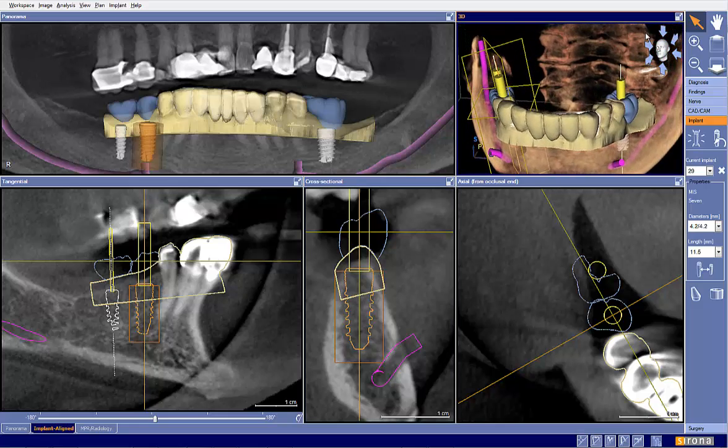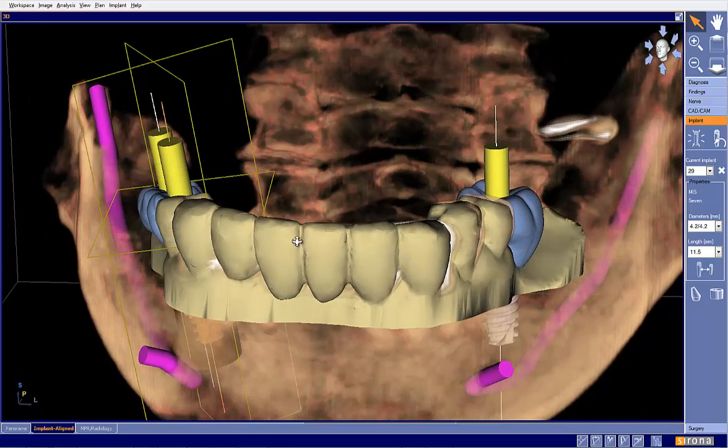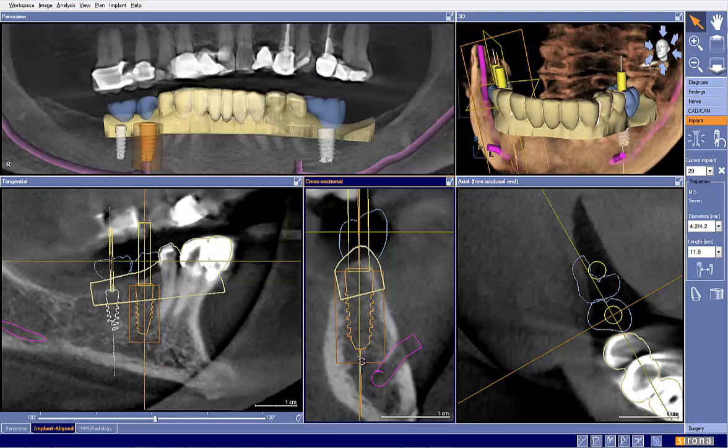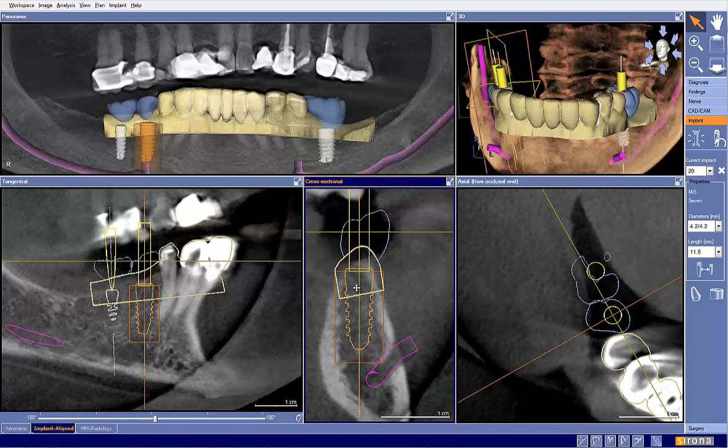Again, the only other thing I would look at here is, again, it looks like we're tilted out when typically these teeth are tilted in. So I tilted to the lingual, so I might actually tilt that in and then bring it out a little bit more to the buccal.